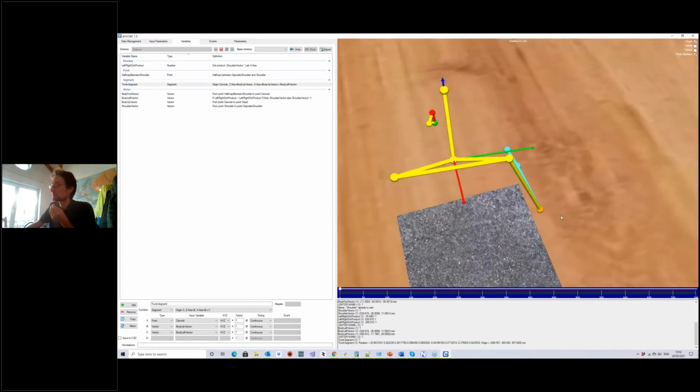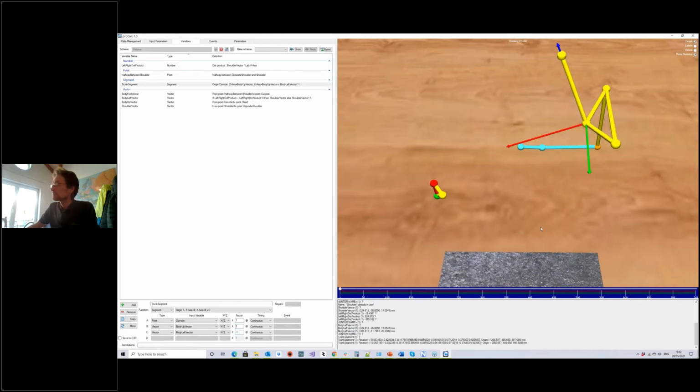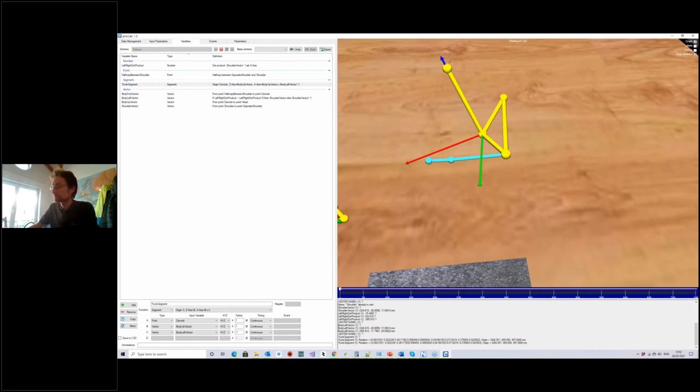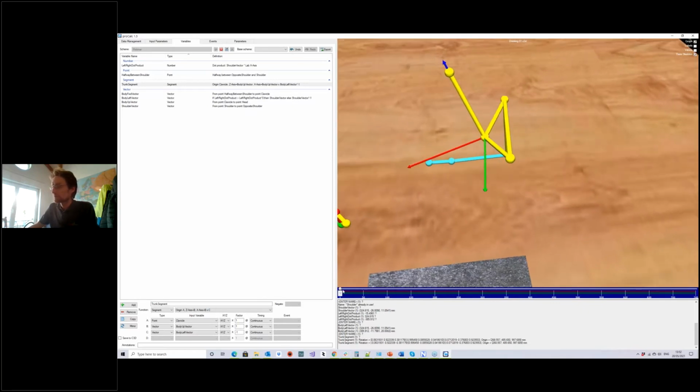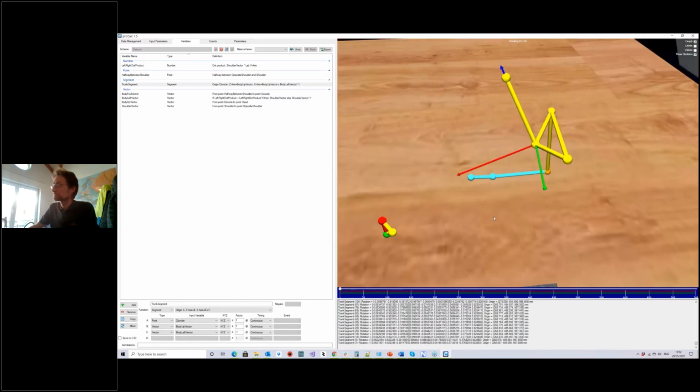In this case, very illustratively, it's now pointing backwards, which we can easily fix by flipping the vector with a factor of -1. Okay. So here we have our body vector. Very straightforward.